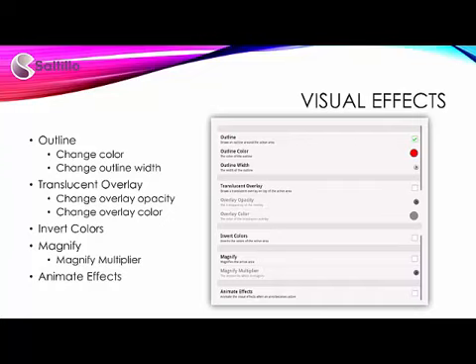Visual effects. Chat software version 2.2 introduced some new visual effect options. These options can aid the user to see their options as they are scanned. The visual effects can be used individually or in combination. Note that visual effect options become available when scanning is enabled.